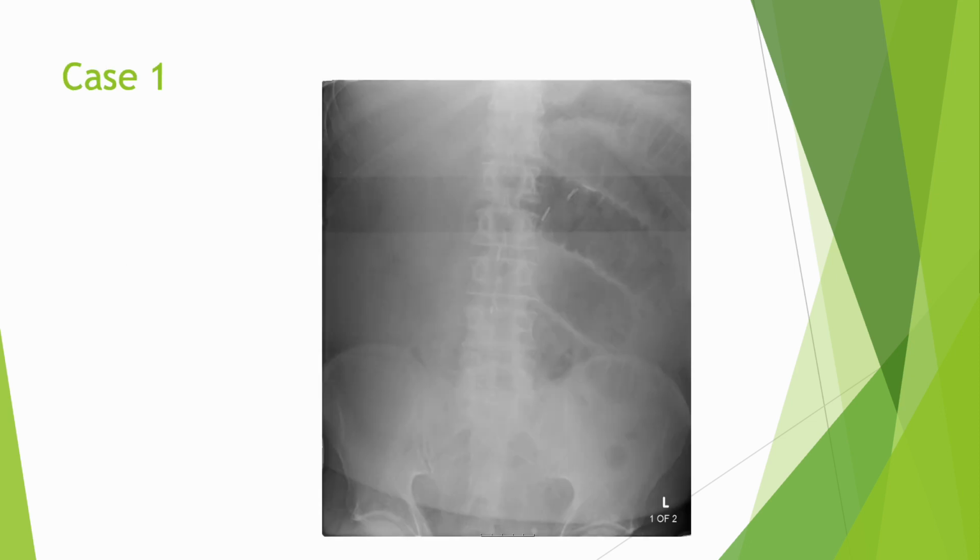So we'll start off with case 1. I would take some time to pause the video and have a look at the image and try and come up with what you think is going on before we talk through it together.